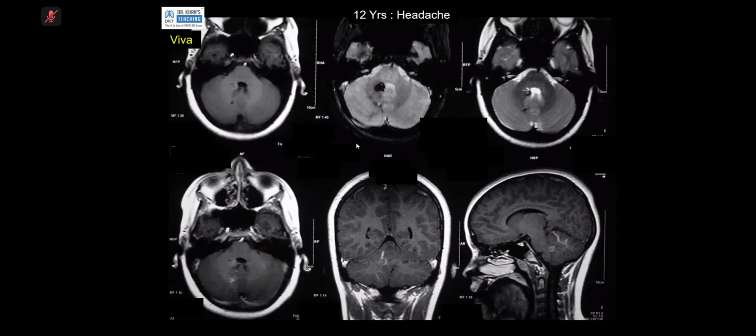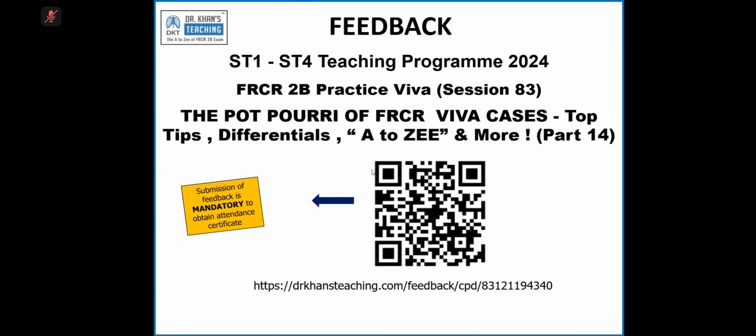Now, look at this one where there was a cavernoma here, 12-year-old. And when we gave contrast, you can see that there's a vessel which is going out. It doesn't change management, but in the exam, it will give you more marks. So ask for it, but immediately tell the examiner that it is to pick up an associated DVA. Please remember that cavernomas at times can enhance. Usually they do not enhance, but that doesn't change anything.